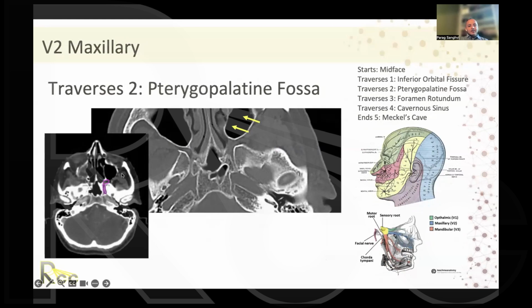So this is, again, as I said, one of the easiest ones for us to contour because we're so used to contouring in the nasal cavity and the maxillary sinuses. Just giving you some idea of how that goes. And the nice thing here is that treating to the doses that we want to treat this cancer to is relatively easy because there are not very many other organs at risk that you're worried about in here. It's just musculature, soft tissue, fat, and bone. So if you need to treat gross disease along this path to 70 gray, it really is not a big issue for you to be able to do that.